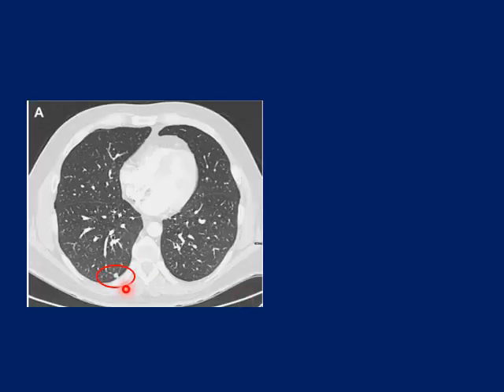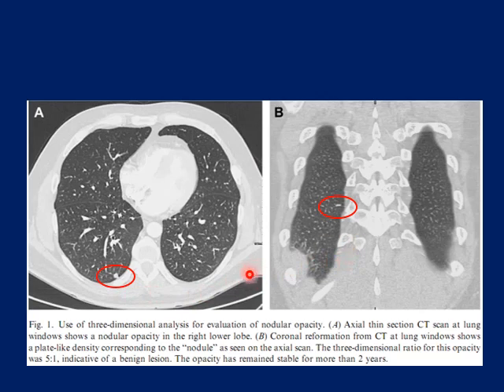For this example, what is this? It seems to me this is a nodule, rounded in shape. We can tell a lot about it. It simulates deposits, but we should be sure that this lesion is spherical in two perpendicular views, because here it is just a flattened nodule or fibrotic nodule. This is more or less benign. This is a fibrotic nodule not representing a suspicious lesion.